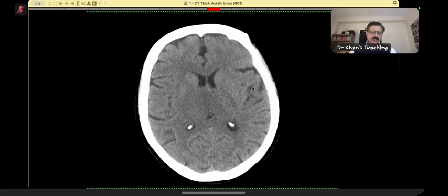And then, of course, in children and young adults particularly, always remember ADEM, because please remember, ADEM is a white matter disease which also involves deep gray matter, and the thalamus is deep gray matter. And then the fourth one is gliomatosis. End of story. These are the top four.